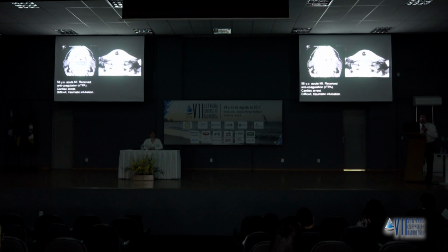And then he had difficulty in breathing and all kinds of problems, hypotension. We did a CAT scan, and you see here a huge retropharyngeal hematoma from the acute TPA treatment. And that's something that can happen in this space.